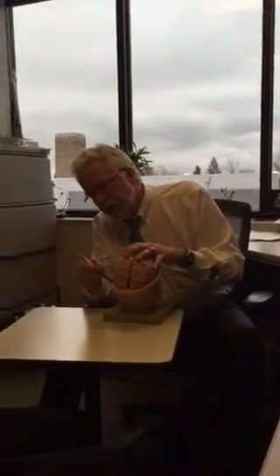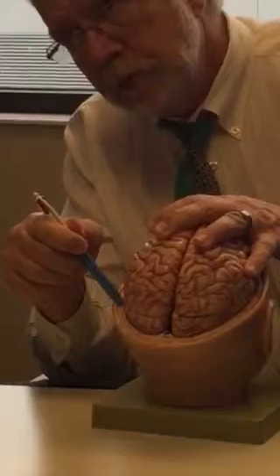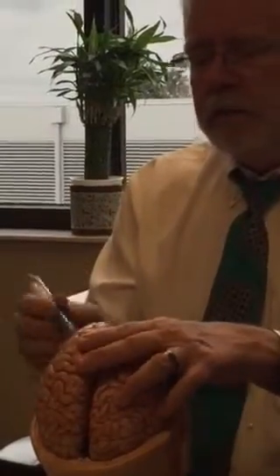When I try to have patients and their families begin to understand the anatomy, I think it's important to distinguish. At least in your case, there's blood in between the brain and the skull. And then there's areas of stain that we saw. And then also down deep, inside of there, were some areas of contrast that you saw that were different.